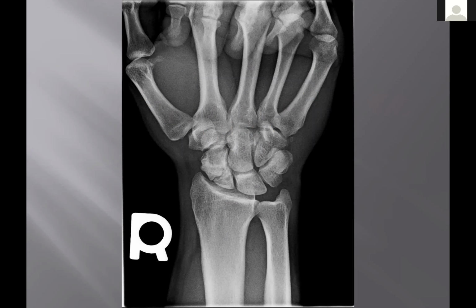Fractures, scaphoid. Good. So you go here in the scaphoid, and that scaphoid does not look normal. The most common fracture of the wrist is the scaphoid fracture. That might show up on your little quiz. Come on, that's easy. The most common wrist fracture is the scaphoid. By the way, the second most common is the triquetrum. Third most common is the capitate.